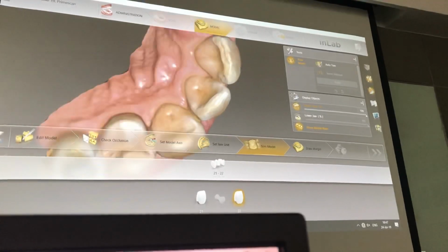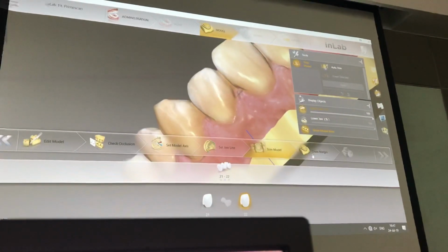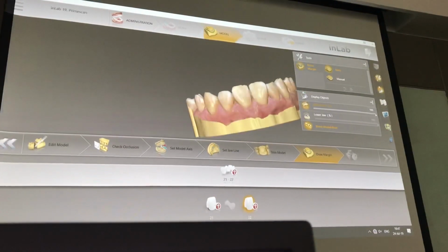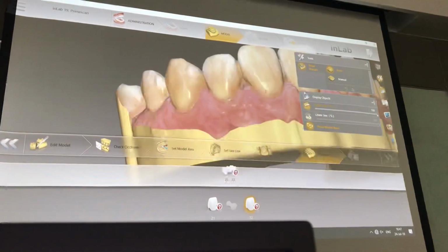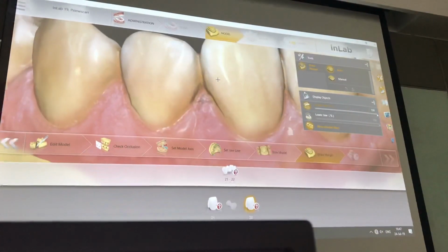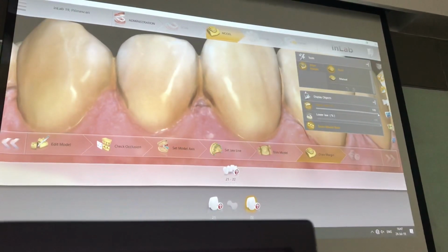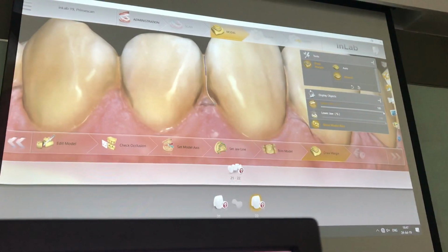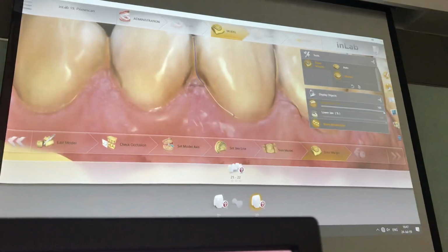Reset it. And the reason why I reset it is that when I mark the margins on both the central and the lateral, I can actually see where I've marked the margin. So if you're going to seed a layer, and by any chance these margins touch or intersect, then it doesn't seed, it gives you an error. Okay?